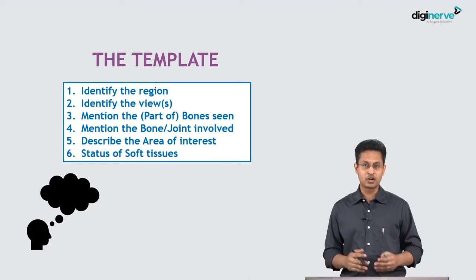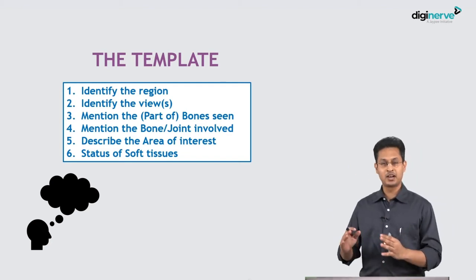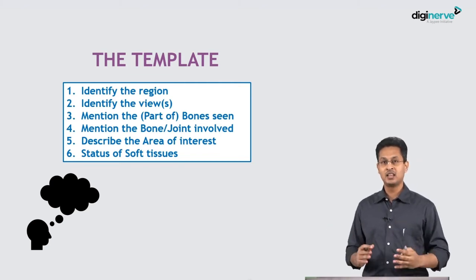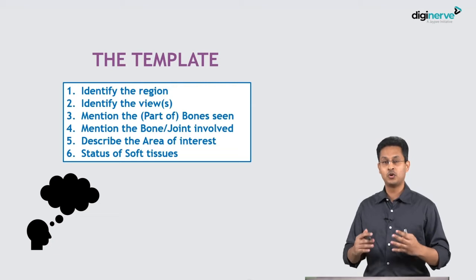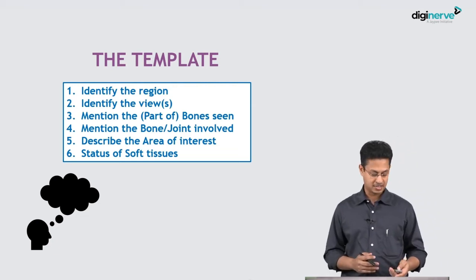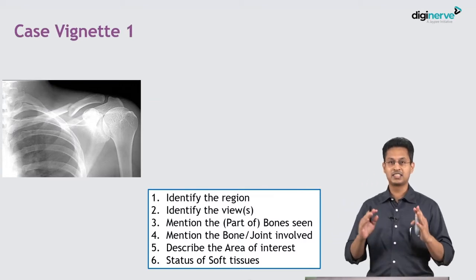So let us start off with the cases. This template remains throughout the series, so that will help you in understanding this whole exercise as I take you through the case examples and the X-rays. So let us start with the first case.